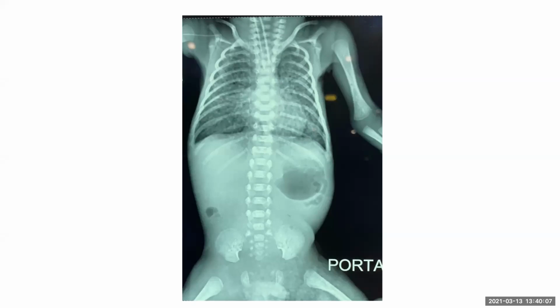I'm just looking in the abdomen for any abnormality, which I cannot see. The bones appear normal. Both humeral heads are not seen, so this may be a premature child. I'm also looking for any pneumothorax, but I cannot see one.